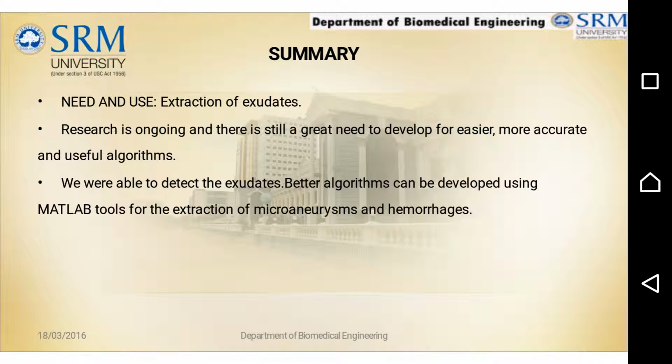Let's summarize this way. The need and use is to extract exudates. Research is ongoing, and there is still a great need to develop easier and more accurate and useful algorithms. We were able to detect the exudates. Better algorithms can be developed using MATLAB tools for extraction of microaneurysms and hemorrhages.